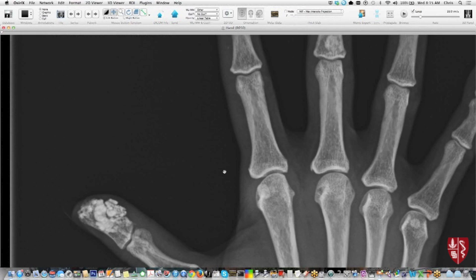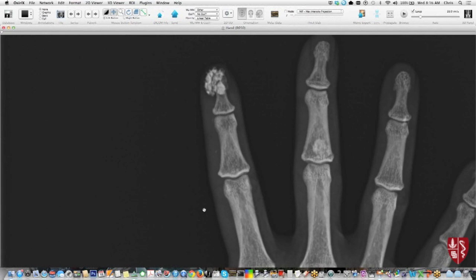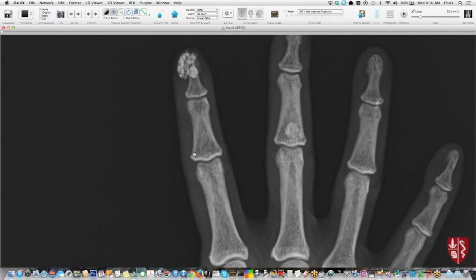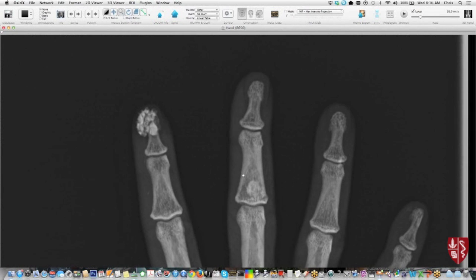So things that cause calcification, like scleroderma, dermatomyositis. You can have dense material in the soft tissues from iatrogenic, well, not really iatrogenic, but sort of traumatic reasons too, like the classic one is a paint gun injury where somebody injects paint into their digit or something like that. That's not that common, hopefully. But this is an example I got from Kate of scleroderma.